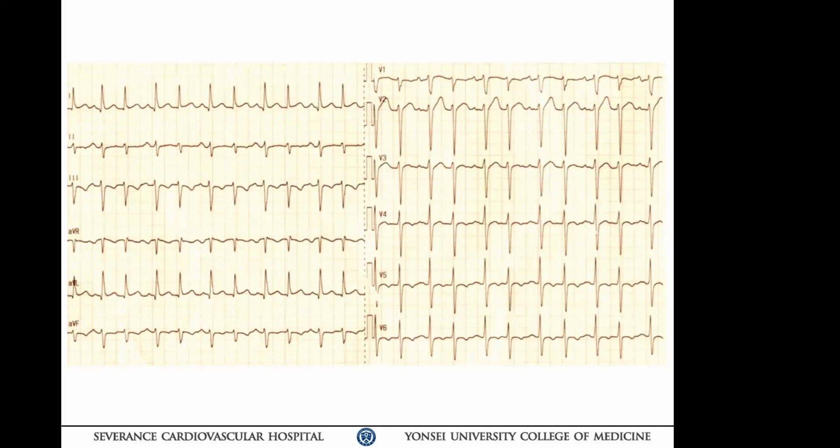So the other differential diagnosis would be what happens if you have a conduction system PVC interacting with the anterior fascicular rhythm. That would be another diagnosis. You have to put it in here. Even though you guys put a variety of good diagnoses, good thinking, that may explain why the QRS is narrower, axes are slightly different, and coupling is different. Okay? So that's all I can add on your differential diagnosis.